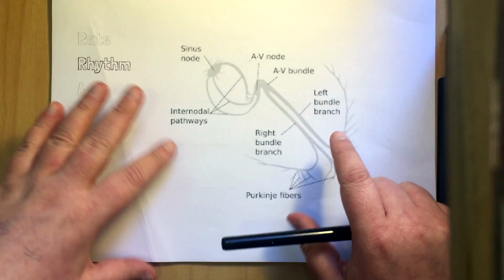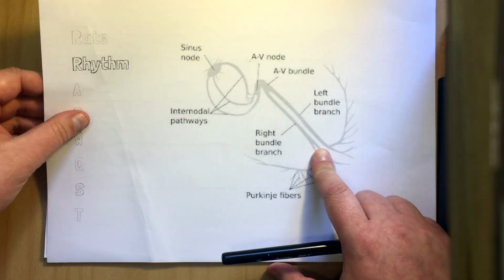So there's a few ways that we can figure out what's going on with the rhythm, and I'm going to teach you a system for doing that. And it's basically pattern recognition at the end of the day, but we're going to learn a few questions you can ask to help you systematically assess what's going on with the rhythm. So in this video, I'll go over the system, and then in coming videos, I'll go over some specific rhythms that you need to learn, and that's going to be some rote learning.